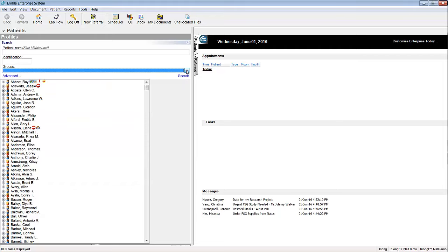Then on the right side here, if there are any appointments scheduled for today, I'll be able to see them here, or whether I have any pending tasks. These are the messages, the internal email that I mentioned earlier on. So for example, I can just click on this one.